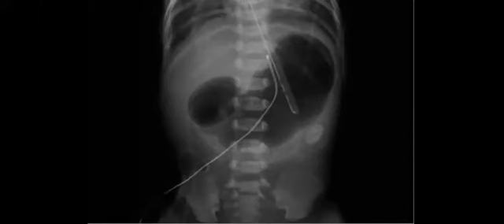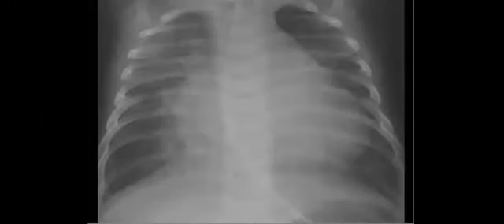Shayma, welcome. So we have what is called duodenal atresia. Yes, duodenal atresia. Why do they show you this heart here? Maybe the patient has Down syndrome and an endocardial cushion defect. Okay, this is an association with Down. So if it is Down, what will it be? VSD, endocardial cushion defect, maybe. Yeah, congenital heart disease, whatever.